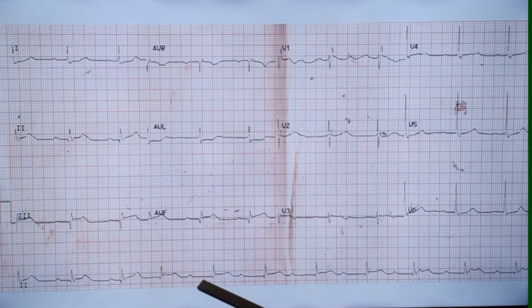And here one P wave would have been within the QRS, we are not seeing. Here also it is probably within the QRS. So unless you have a very long recording, you cannot definitely see the P coming out of the QRS in such situations. If you look at this ECG, in this location you might be tempted to think that this is just a first degree AV block. At one look it may look like a first degree AV block.